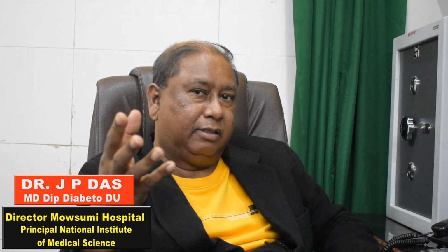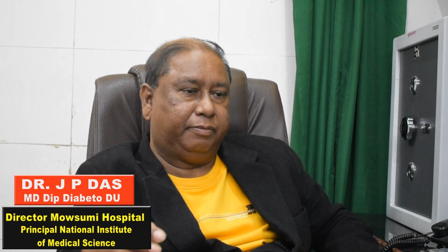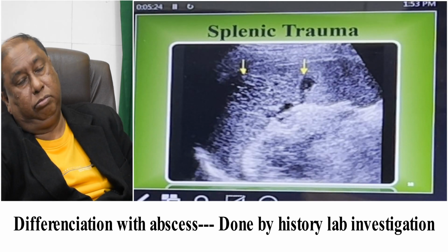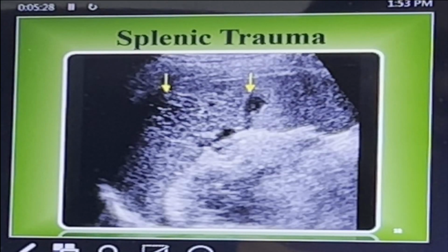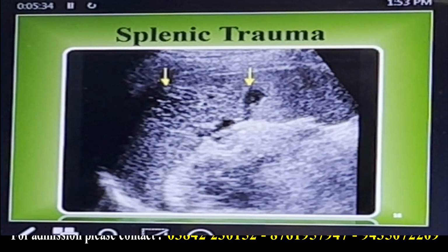It starts to become less echogenic, darker and darker. You have to take history, and by investigation, you will confirm the thing.